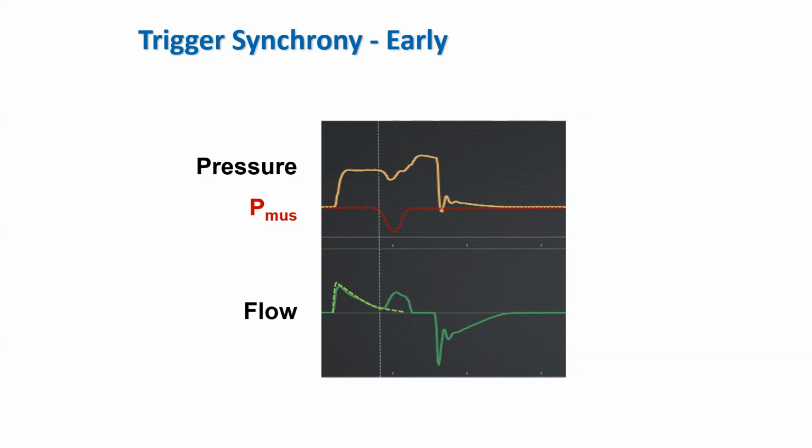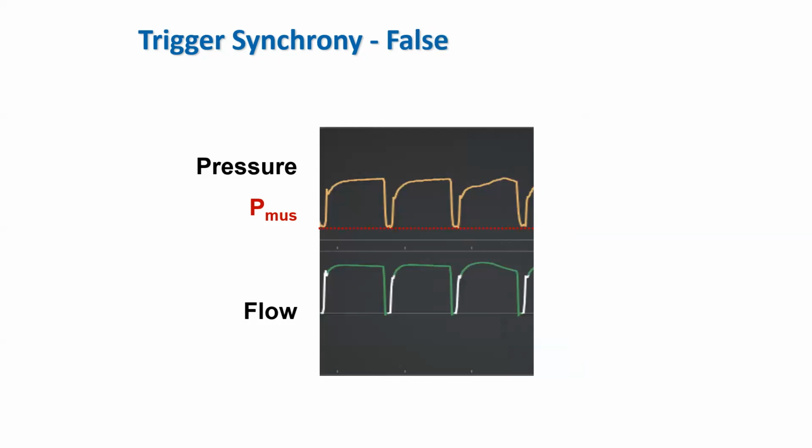So in other words, the ventilator has a time-triggered breath way back here, and that somehow stimulates the patient to make a trigger effort. In the literature, that has been called reverse triggering, but we prefer to call it early triggering because there's many causes of this, not just entrainment or anything like that. So you see a deformation in the pressure waveform, and more easily on the flow waveform in pressure control mode. So that's early trigger.